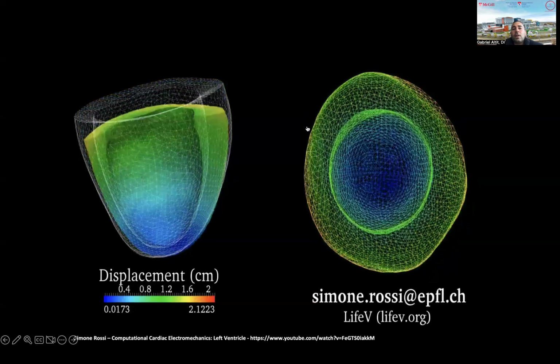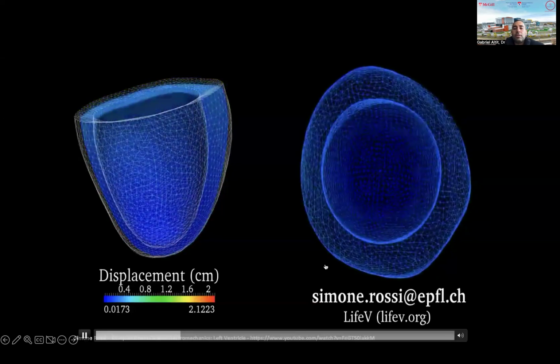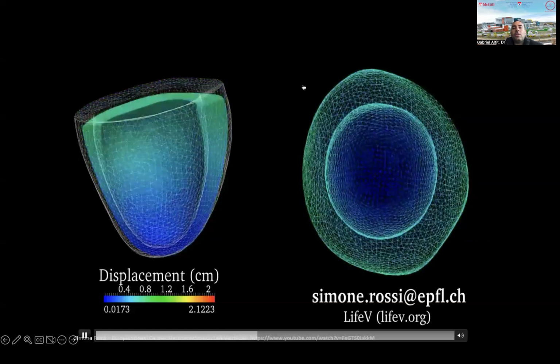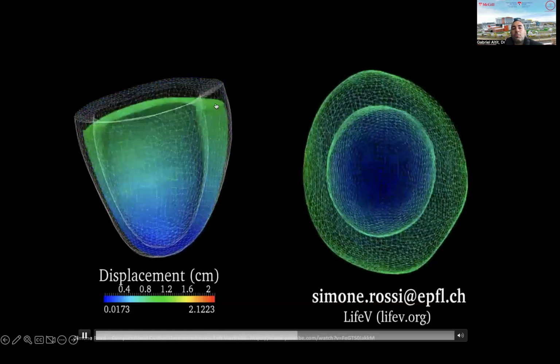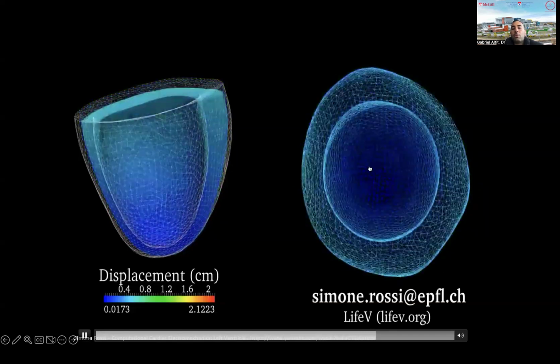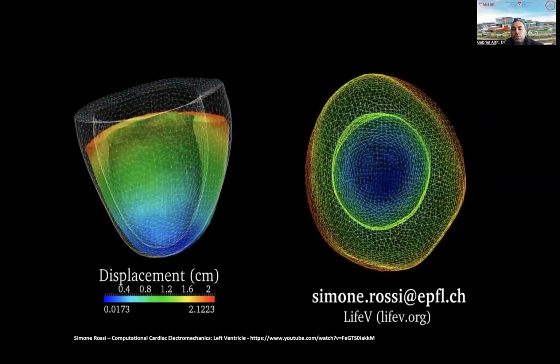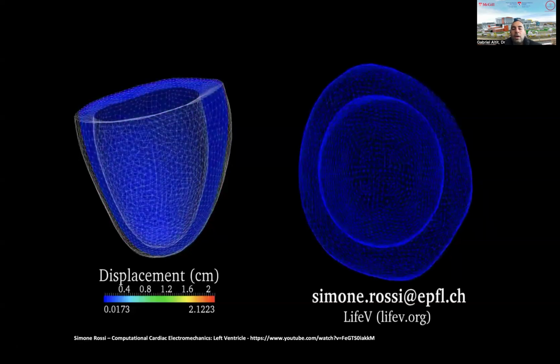So the end result in systole and diastole is represented by this beautiful graph, and I put a reference downstairs here, which basically you have a component of rotation, you have a component of longitudinal contraction, and you have a lot of component of this circumferential contraction plus the radial thickening. They're all part of different properties of the LV that are allowing you to, end of the game, generate flow in your system.